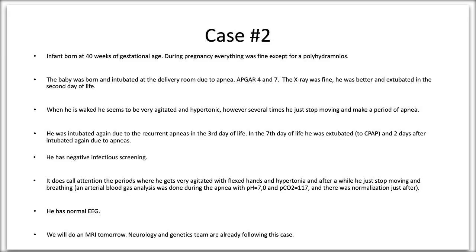So this particular case came from Gabriel, who's on the phone. He's a neonatologist from Brazil. And his basic question, I think, was just to look at the background pattern. So it was a term baby, and the baby was born and intubated, had APGARs of 4 and 7.